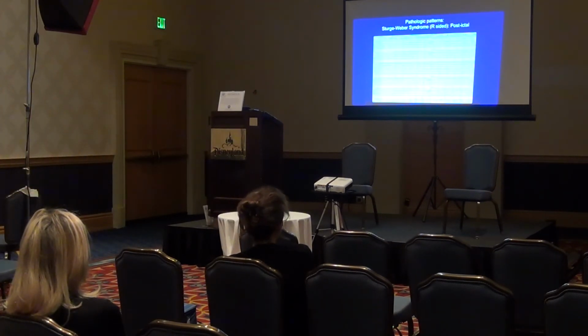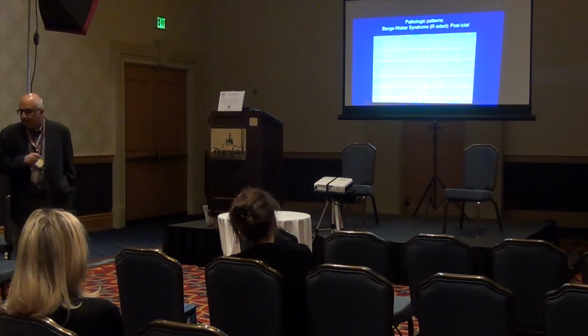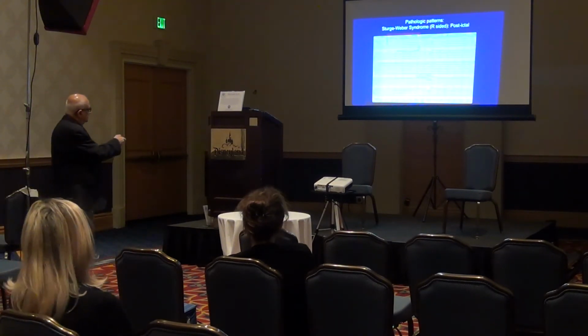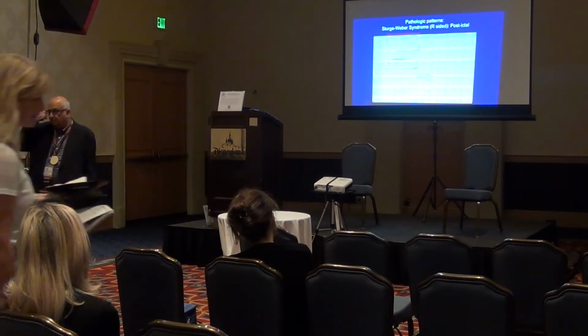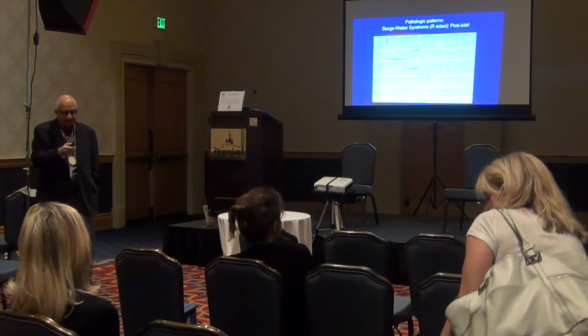What does the right side look like? Slow, right? It looks like slow. They're bigger, slower waves. So similarly, the whole right side here looks slower than the left side. So this patient actually had Sturge-Weber syndrome, and that's what they're showing, slowing confined to one side, right? Here in the coronal montage, as you go from this way, slowing is here, not over there, okay?